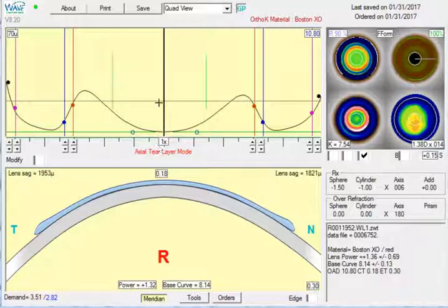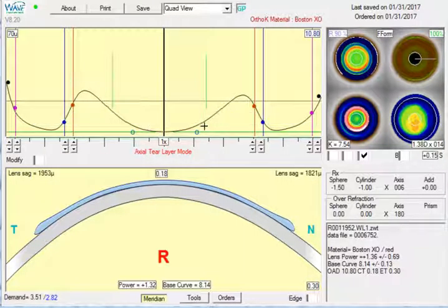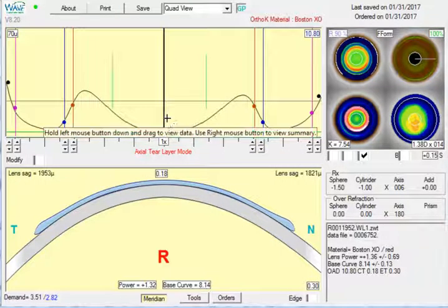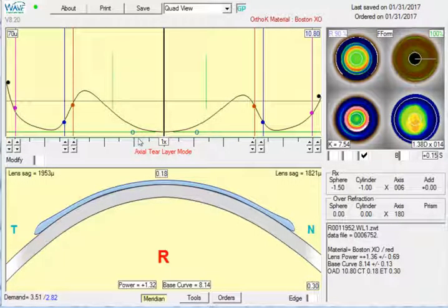What I would recommend doing is changing just the right lens first. The lens for the left eye has a little bit more asphericity, and I think that the increased plus in the center of the lens is balancing out the minus in the periphery of the lens, and the adjusted topo demand is similar to the initial topo demand calculated by WAVE.